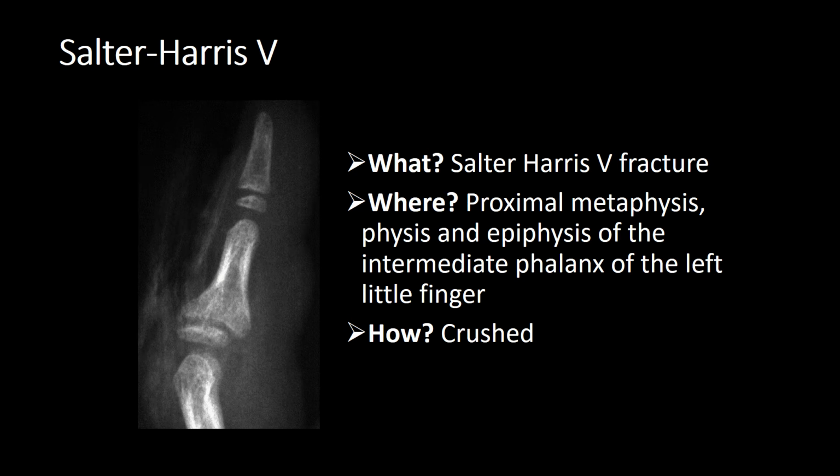So what is it? It's a Salter-Harris 5 fracture. Where is it? It's the proximal metaphysis, physis and epiphysis of the intermediate phalanx of the left little finger. How? It's crushed or rammed, you could say, but I think crushed would be more appropriate.